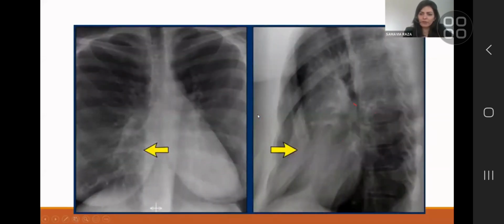Again, lateral views are getting more and more obsolete. The purpose of a lateral view was to clarify findings on the frontal view, to help identify or specify where the pathology is. Conventionally, they have been used to delineate hilar structures. So if you saw something at a hilum and you couldn't figure out if it was a vessel or if those lumps were nodes, on a lateral view you could see those nodes as end-on nodules. So that's something it was used for historically.